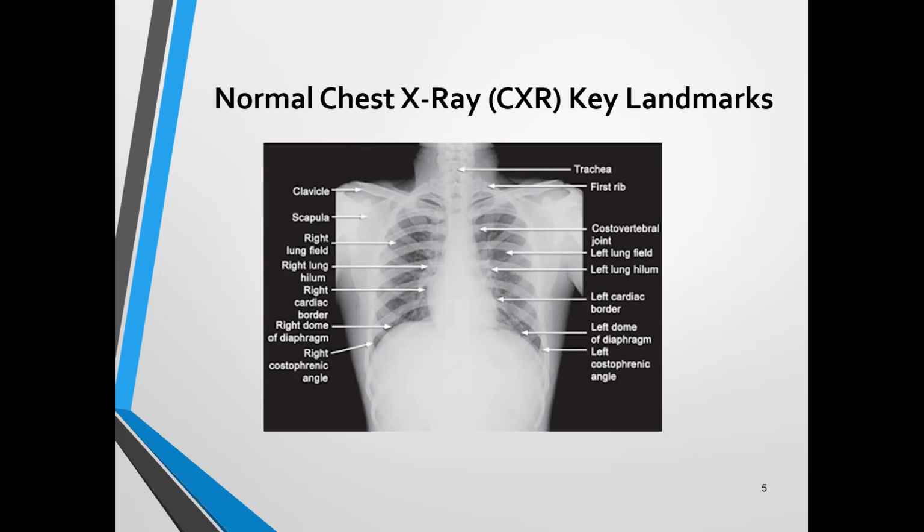What's particularly interesting here is that in this pediatric patient, the cardiac silhouette is crudely one quarter to one third of the entire diameter. It's this lateral diameter that we have here. It's really not that significant. In older patients, not older pediatric, but older patients who have heart failure, in some cases the cardiac silhouette can exceed more than half of that lateral diameter.